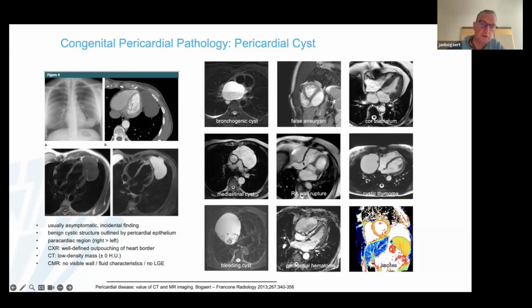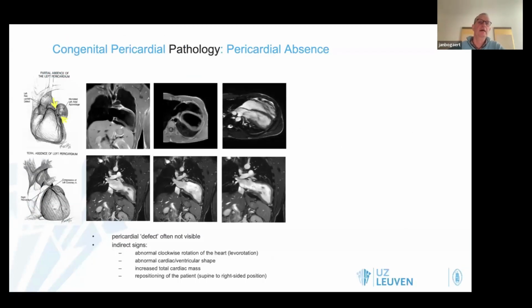These patients had an unknown or unrecognized right wall rupture with something that looked like a cyst along the right heart border. Finally, do not mistake ascites, for instance, as a pericardial cyst. But most often these conditions are quite easy to differentiate.